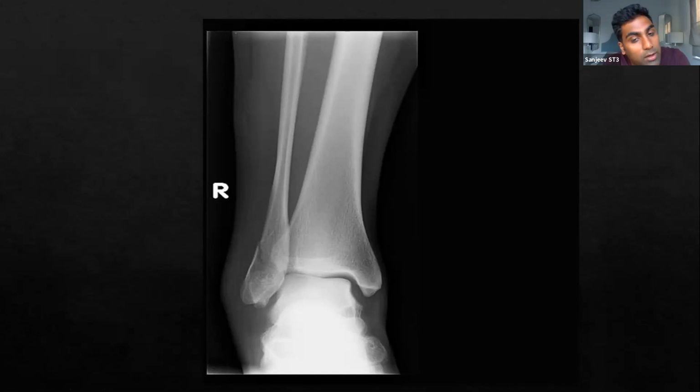Oh, fine. Okay. I really wouldn't stress about that. If they're going to give you one in the OSCE, it's going to be either a medial malleolar fracture or a lateral malleolar fracture, and it will be overwhelmingly an AP view. The Mortise view is basically where you'll see the talar dome nicely in profile. But definitely at this stage, don't stress yourself about differentiating between the two. I'll just keep it simple and say AP, because even a Mortise view is technically an AP. Is that all right? Brilliant, thank you.